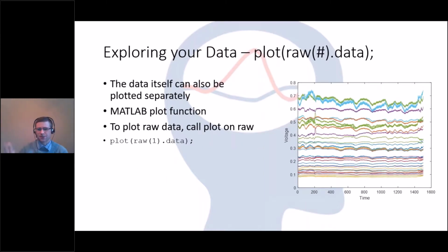Once we go from there, you can also use just the basic MATLAB code. You don't have to rely solely on the toolbox. So there's always the plot function. For me, I think this is actually, at least for seeing the data, much more intuitive because you see all channels. It's a little bit more spaced out. The event markers aren't blocking anything if you're not so interested in that at the start.